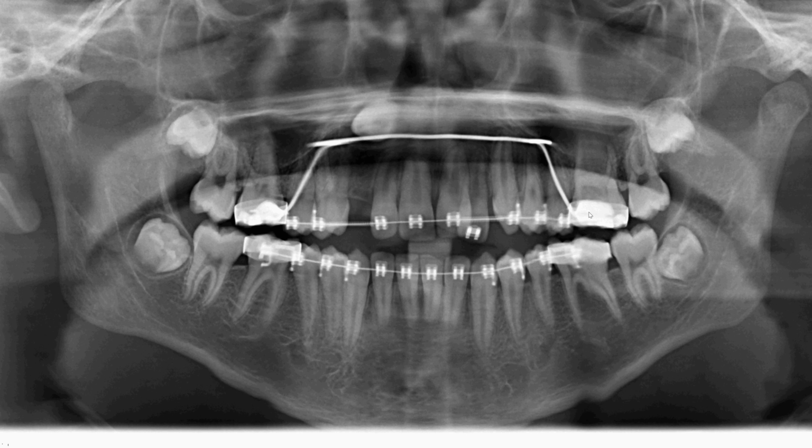Well, one of the options could be that this patient has unusual root morphology, right? So that could be one option. Or some of you may consider there's a rotation of the patient's head, because as you know, if the patient has rotated, one side of the jaw appears wider, whereas the other side of the jaw appears constricted. But looking at the mesiodistal distance of these molars, it still doesn't explain why a single molar is wider.